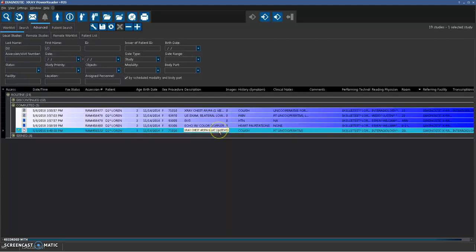This is one more video tutorial on when your exams are going to InterRadiology. So this video tutorial is for the X-ray or ultrasound techs that are used to using InterRadiology. I'm going to run through things a little quicker here because at this point you've probably already watched the other tutorials, but I'll remind you of some stuff as I go through this one.